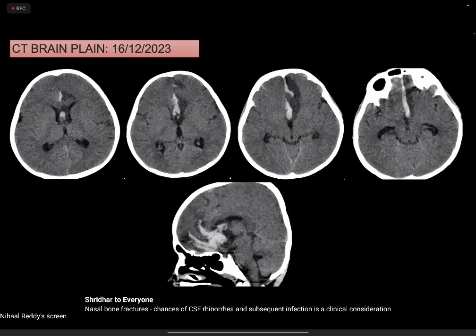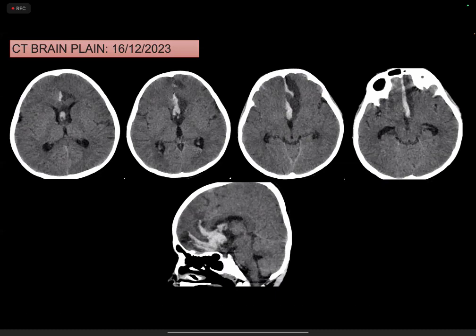Okay, we can see extraaxial hemorrhage out there in the midline in the frontal region, extending into the ventricles, some subarachnoid hemorrhage too, and the cortex is demonstrating edematous, vasogenic edematous changes actually. So the hemorrhage extends up to the falx cerebri. Better appreciated on the SAG images out here. So these are the only images we have.